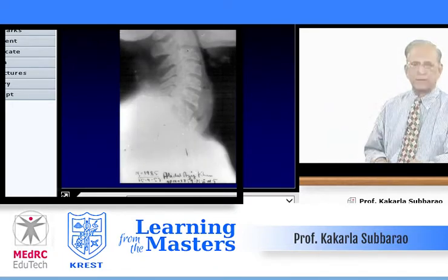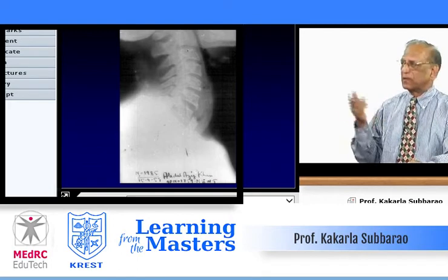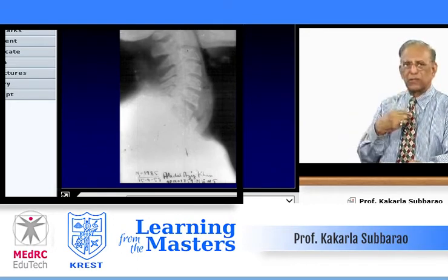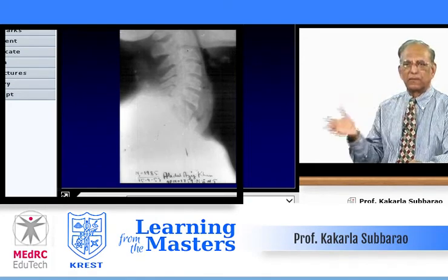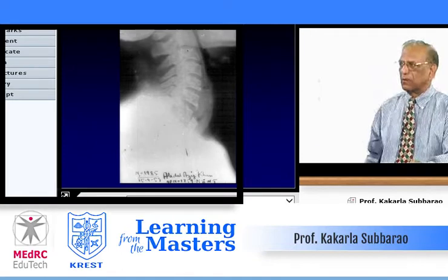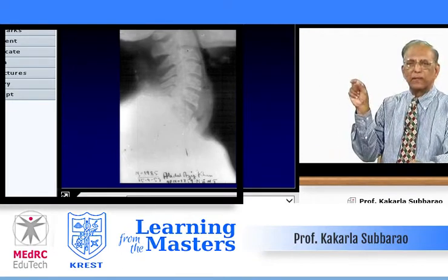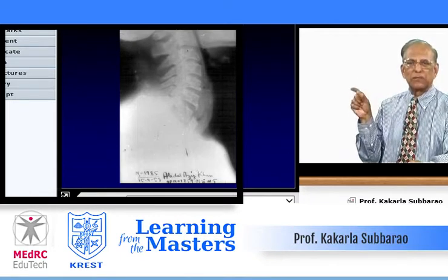Say in adults, in rural areas, most of them are non-vegetarians. This patient was eating fish and a fish bone is stuck in the pharynx. He came to the radiology department. Lo and behold, you see the swallowed air and then widening of the prevertebral stripe. That itself does not mean there is an abscess, but there are some inflammatory changes there.